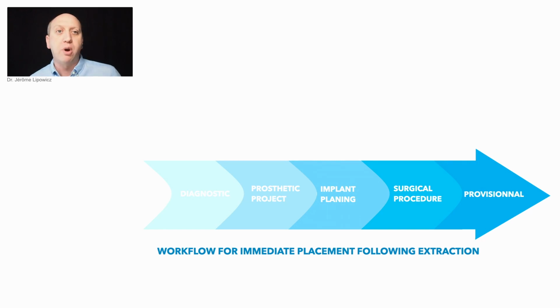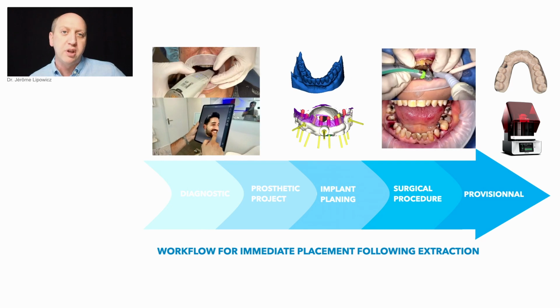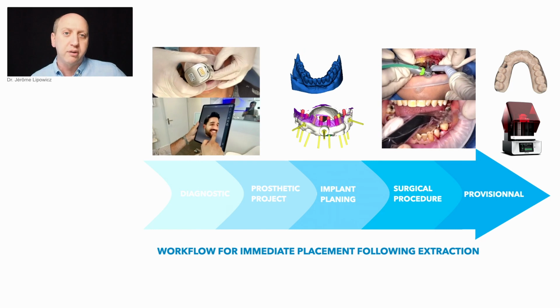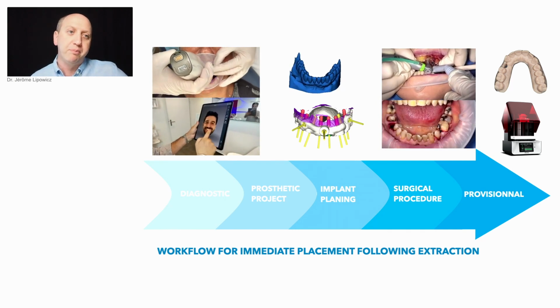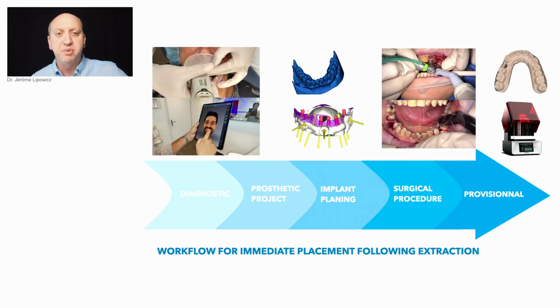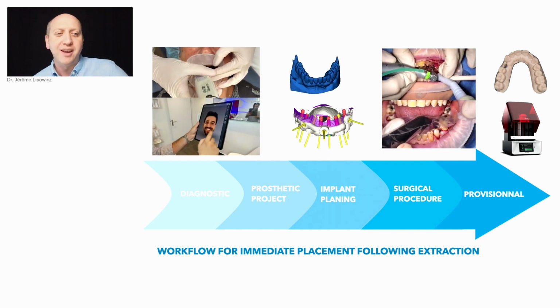So I would like now to show you how our immediate placement and immediate loading work in a digital workflow. We have at our disposal so many digital tools. We have intraoral scanners, we have the face scan, we have planning software, we have CAD/CAM software. They all provide us a precious help, and they make us work differently for planning an implant, foreseeing its stability, placing this implant, assessing the stability with the infamous Osstell system, and immediately restoring the missing tooth.